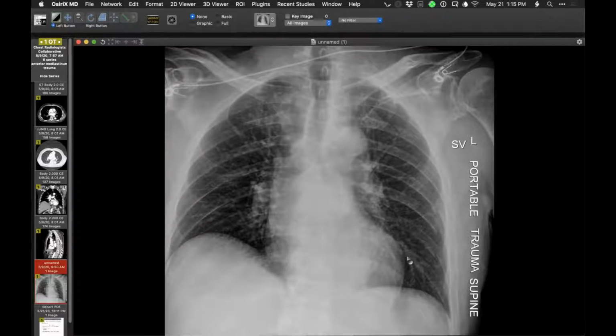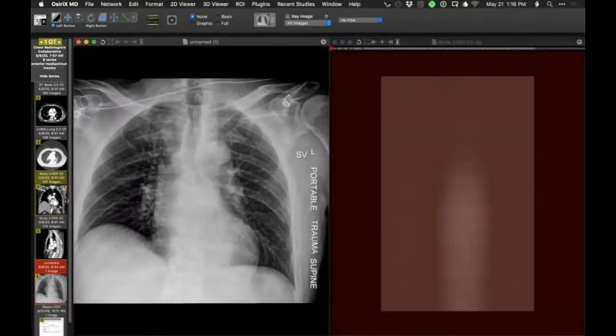Is there something subcarinal? Here? Yep, exactly right. So right here is the abnormal mediastinal lung interface. It's in that location with associated opacity. And certainly I don't associate that with trauma. Usually if you have vertebral body fractures, which may be hard to see, the paraspinal hematoma doesn't produce something that looks rounded, doesn't usually produce a focally convex interface like that. So that turns out to be this.